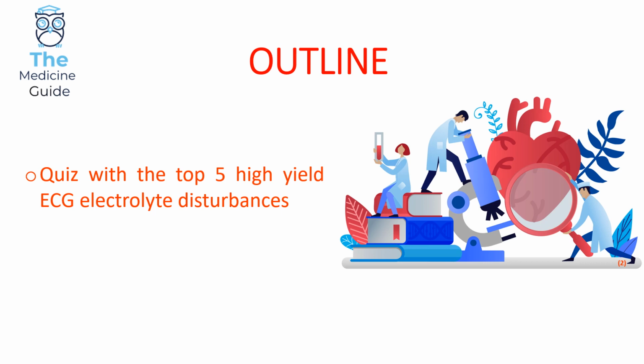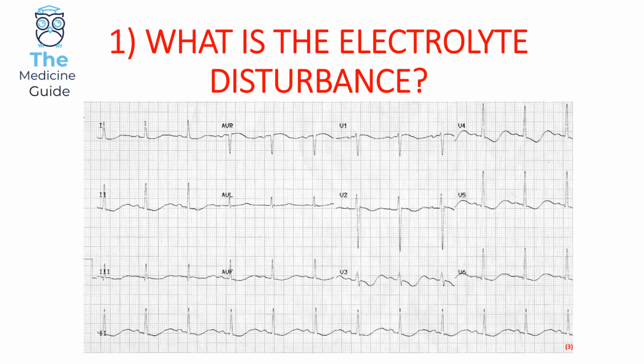So let's begin. Number 1, what is the electrolyte disturbance? I'll give you 20 seconds for this ECG. You can either choose to pause the video at this point, or you can wait 20 seconds.